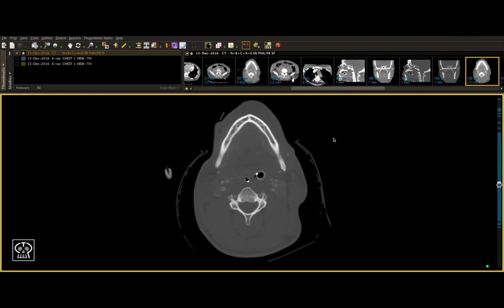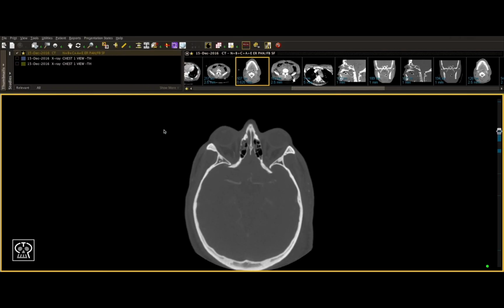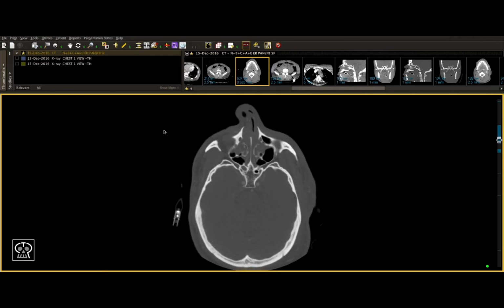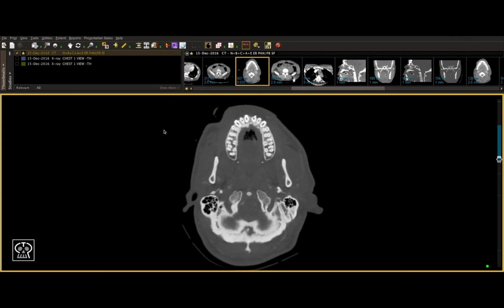However, although this is useful in other parts of the body, when it comes to a CT facial bones, we want to be as low and as thin as possible because some of these fractures are very minimally displaced and only in one plane, so you want to give yourself the highest chance of seeing them. Let's compare that now with this view, which has cuts of 0.625 millimeters. As you can tell right away, it takes longer to scan through the image, however there is much more detail and much less distance in between the cuts. This facilitates our analysis greatly.